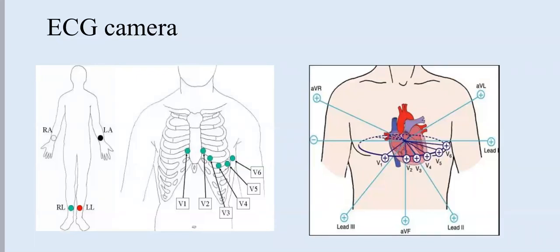The other thing is the right ventricle. The right ventricle is on the right side. And our V1 is overlapping the terminal portion of the RV, but the majority of the RV is still on the right. So the 12 lead ECG misses the right side. And of course, the posterior aspect of the heart. So what can we do about that?